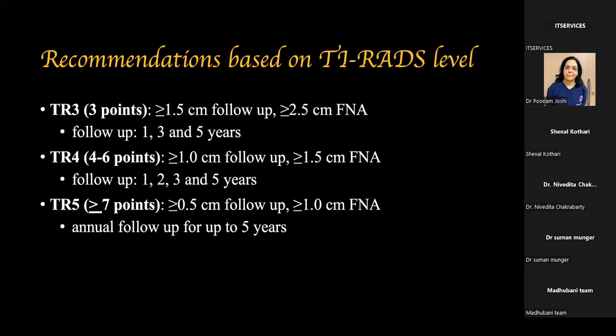Okay. Now, there are certain recommendations based on the TIRADS level, as we've seen. So if TR3 means we are assigning a total of 3 points, what are the follow-up and FNA recommendations? If the nodule is more than or equal to 1.5 centimeters, then you have to follow up. If it is more than or equal to 2.5 centimeters, then FNA has to be performed. And what are the follow-up guidelines for TR3? 1, 3, and 5 years.